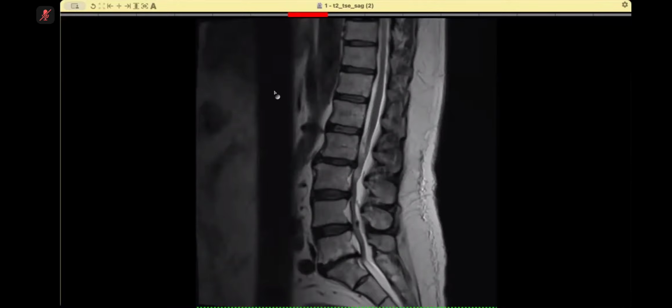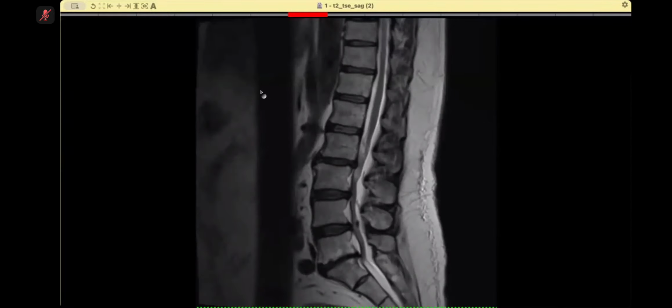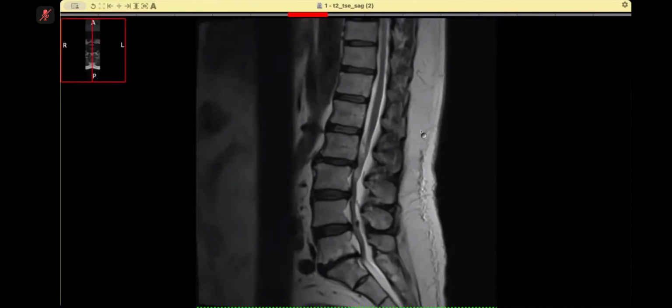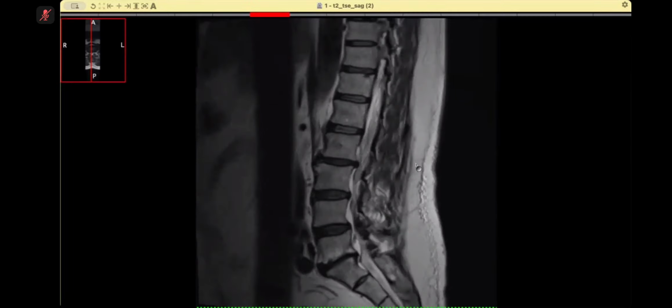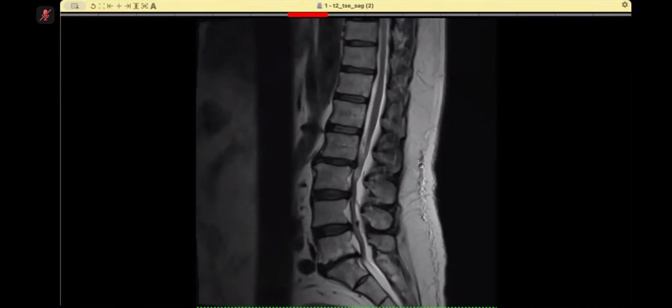So what are the learning points here? One is the entity epidural lipomatosis. The eye sees what the mind knows. I have not shown you on this T2 weighted sequence that this is the conus. If you see the nerve roots, something is wrong. They are jumbled together. The candidate did well to point that out, but the candidate's mind was going into arachnoiditis.